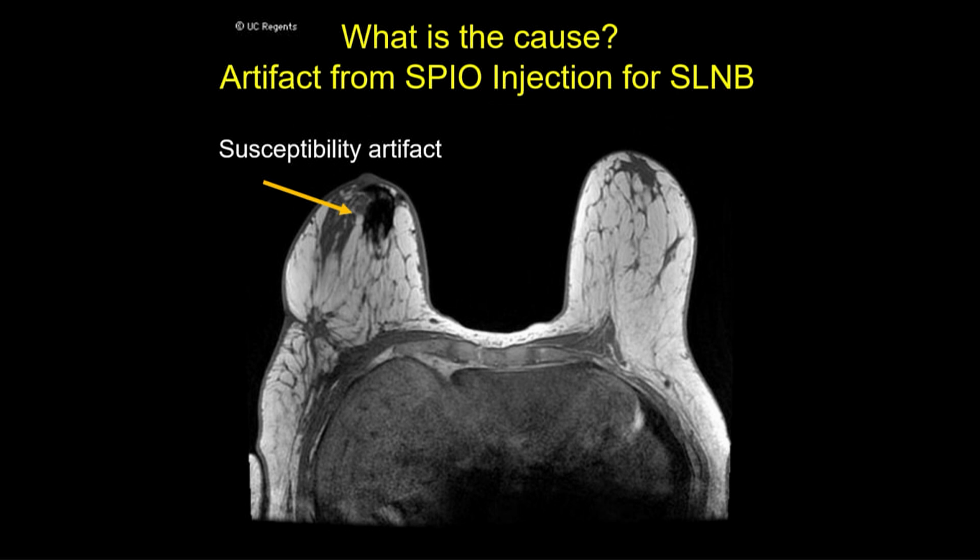So as radiologists now, we inject peritumorally this iron oxide particle before they go to the OR. So we localize them with the seed, and then we also inject the iron oxide particles around the tumor. So this is work in progress. We will have to wait for these patients to come back for their annual MRI before we'll know if it worked or not. But the idea is that the surgeon resects the injection tract as well as the tumor itself. So we'll let you know.